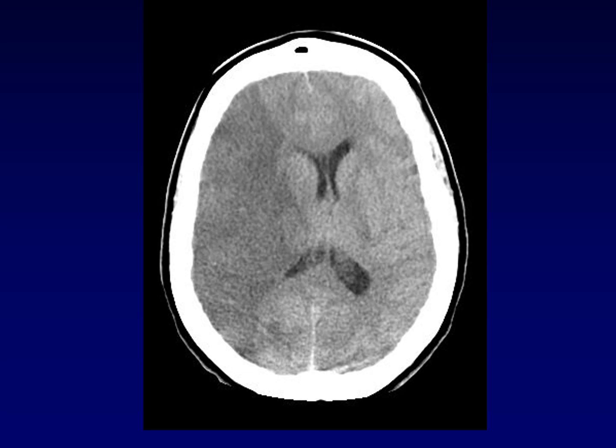So here's that same CT scan that we were looking at, and we're going to apply the vascular territories here. The anterior cerebral artery territory is outlined in blue, the posterior cerebral artery territory is outlined in red, and the middle cerebral artery territory is outlined in yellow, and that's what's abnormal. That's why we have these straight lines: they demarcate the different vascular territories supplying the brain.